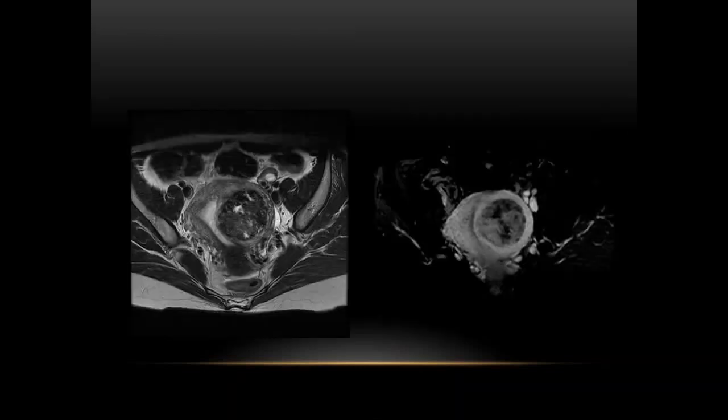This is an interesting example of a leiomyosarcoma. This woman was in her early 50s, had abnormal bleeding, and they did a hysterectomy on her and just happened to identify this as a leiomyosarcoma. Incidentally, they can be identified.